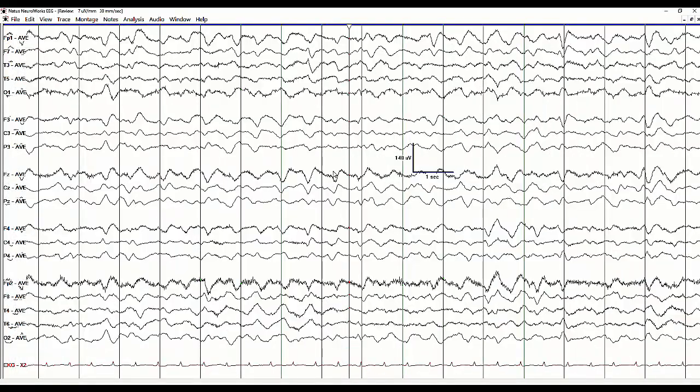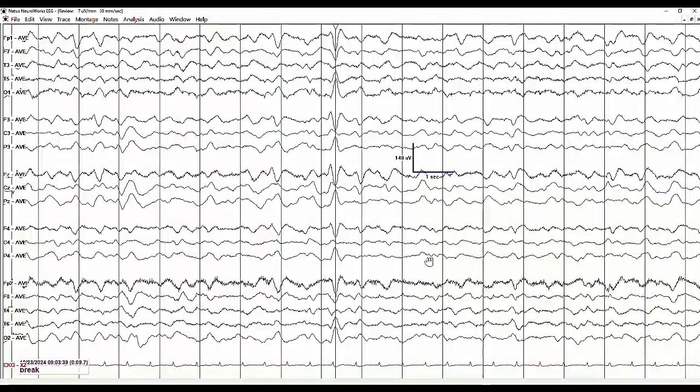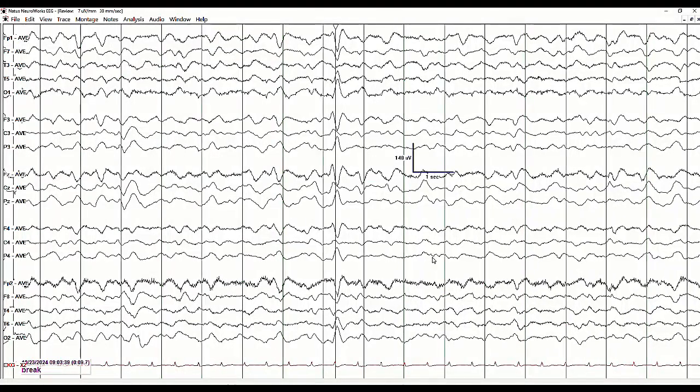Brain death. Of course, a mild encephalopathy would be the patient who has maybe a posterior dominant rhythm which is just a bit under 8 hertz at times, maybe 7 hertz, 7.5 hertz, and or they have some transient or intermittent generalized slowing, but it doesn't dominate the background. Maybe it's rare or occasional. So this is a well-formed generalized sharp wave discharge with triphasic morphology.